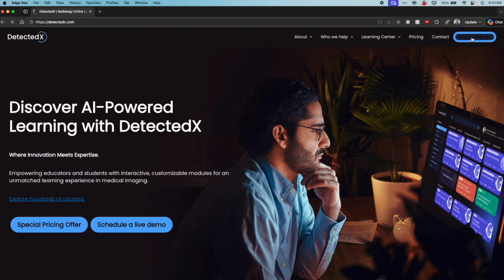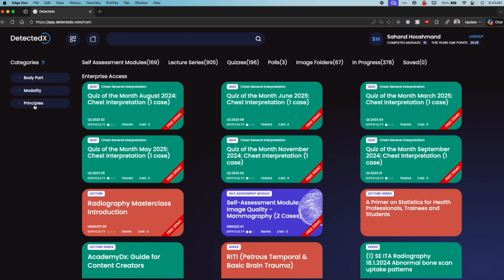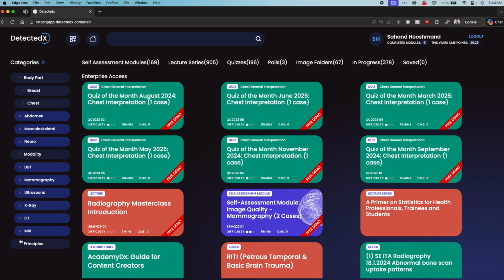Here's a quick walkthrough of what's available on the DetectedX Learner platform. I'll first show you an overview of the type of content available, the body systems and regions these cover, the imaging modalities and scientific disciplines, and ultimately who this is all designed for. Then I'll show you a couple of real examples so you can see exactly what the learner experience looks like.